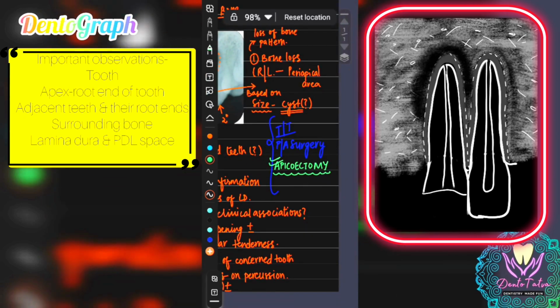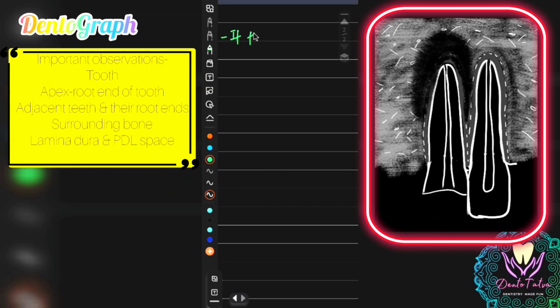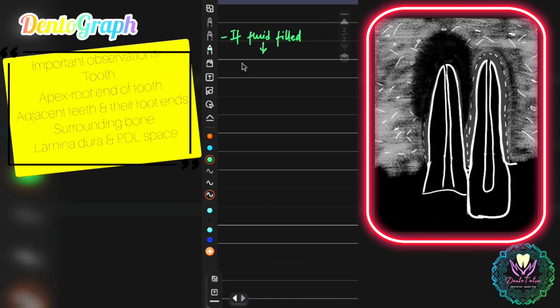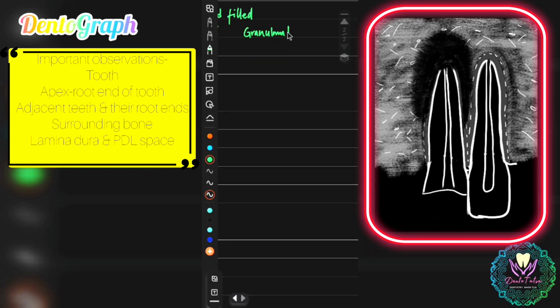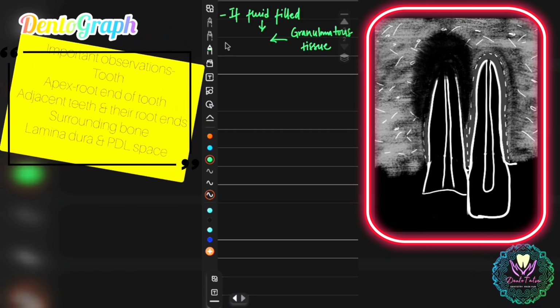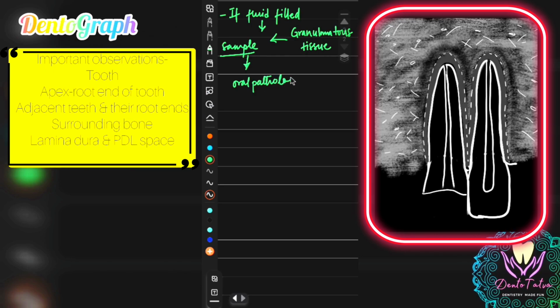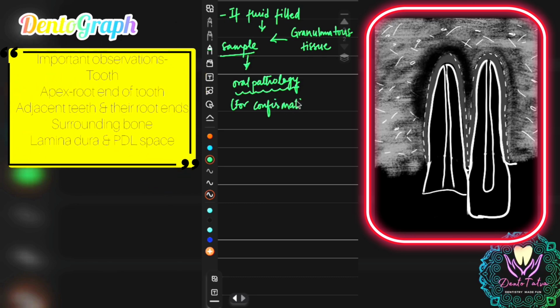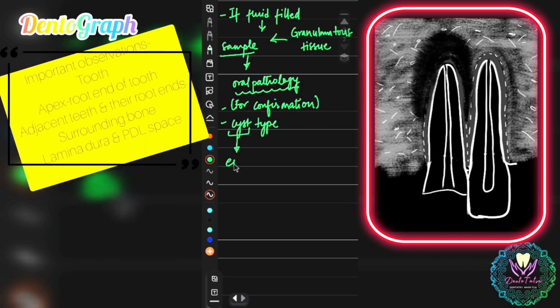There is non-vital pulpal tissue which possibly leads to bacterial ingress and growth. So there could be a presence of a sinus tract, and if you do the sinus tracing, it could lead to the tooth in question. In this case, if we would have done the sinus tracing with a 2% 25 number GP, it possibly would have led to the root end in relation to 12. If it is diffused and the size of the lesion is small, then our initial diagnosis could be related to periapical abscess. If the lesion would have been smaller, we can even approach it non-surgically.